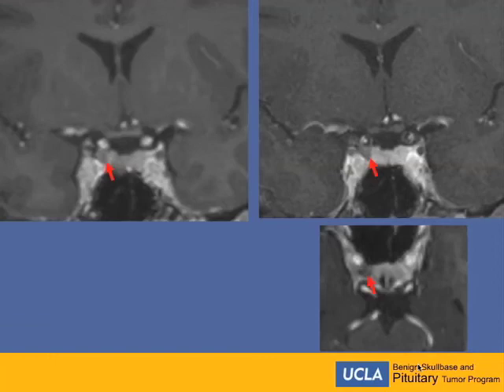So it's not really helpful, because I saw the target without doing a dynamic. And then this is the summary slide. You can see the lateral aspect, and if you do a reformat imaging of this, you can see the pituitary gland is from here to here, and the mass is located here, which is outside the cavernous sinus, in a mostly exophytic location, but we believe this is in the pituitary gland.